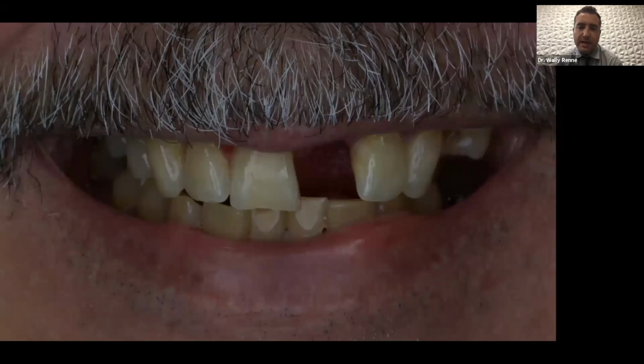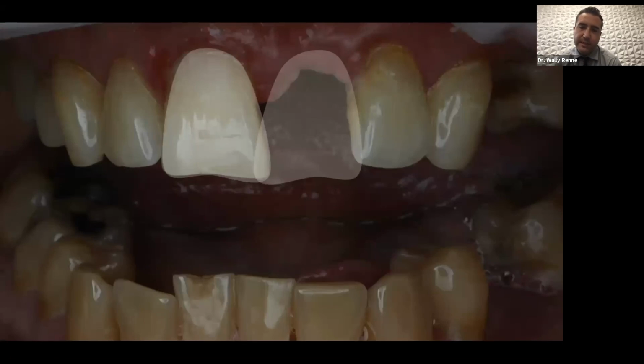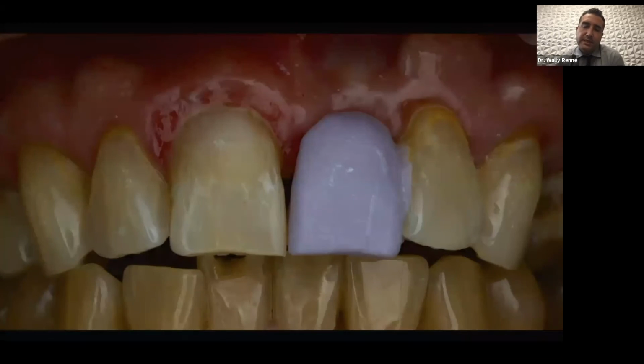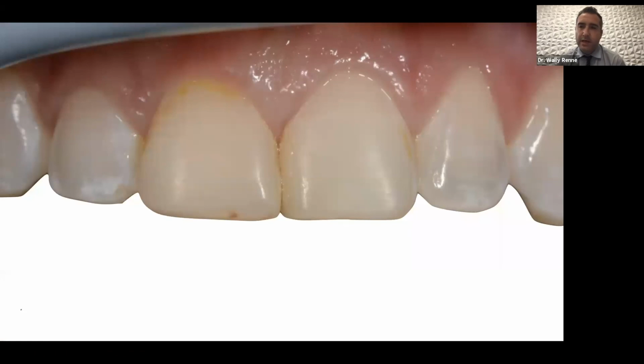So we threw it into Smile Design software, and it's a 3-second thing. You take the photo, you load it up into the Romexis Smile Design, and you do a quick mirror image of the silhouette of the adjacent tooth, and you can see we have major overlap. And so I morphed the tooth about 1 millimeter to know how much I needed to take off so that we could have a symmetrical pontic between 8 and 9, so we could get that shape and size correct for this patient.